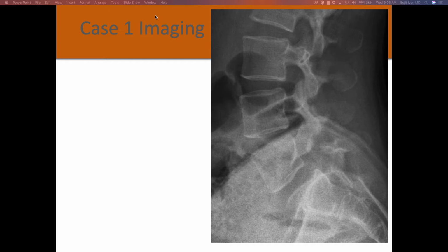I want to point out these are selected films. Selected films. Don't complain. That's on the record. We started with a hard one, so let's take a shot at that. Not yet. Does anybody see anything? It's not connected. That's good.